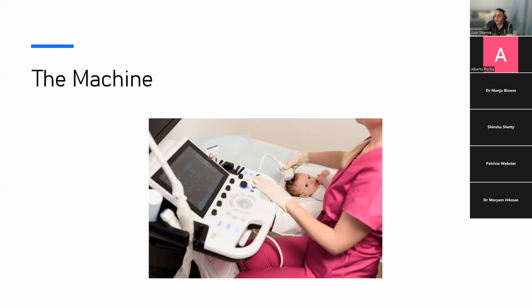On the other hand, what you also have is a linear probe if you want to see meninges, and a linear probe will give you frequencies well up to 15. So if you really want to focus on the more superficial areas of the brain, this is an option. And then you've basically got what I would say is the sector or the convex probe. And you can't see the convex probe over here, but I will show it to you.